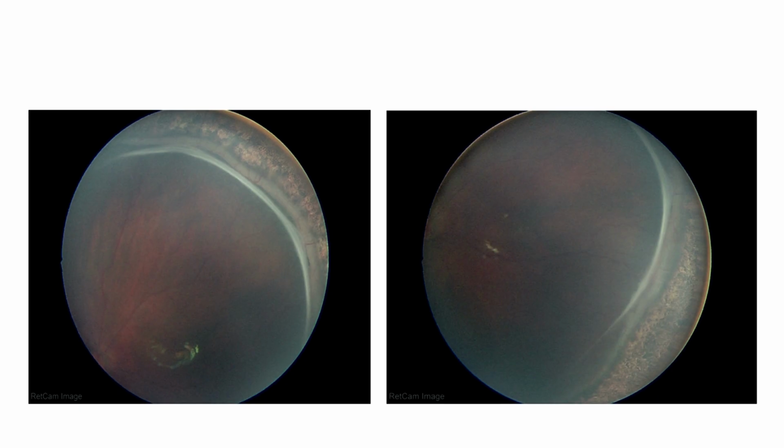Remember one thing, it's not necessary that you should always have a tractional retinal detachment. You can have a tractional schisis also. The retina can be split into layers behind the ridge. That's also a point. It's not always TRD. There can be tractional schisis as well, which can extend all the way up to the fovea. It's sometimes very difficult to see, and that's where the OCT can sometimes help you. You can go ahead. Yes, sir.